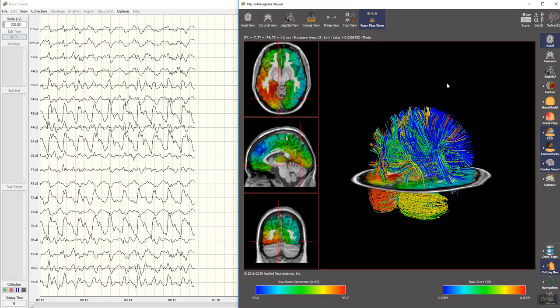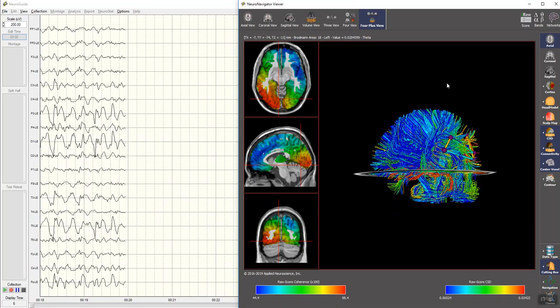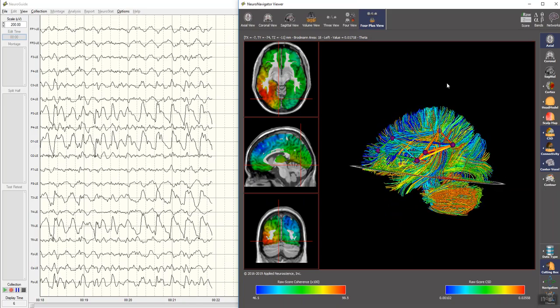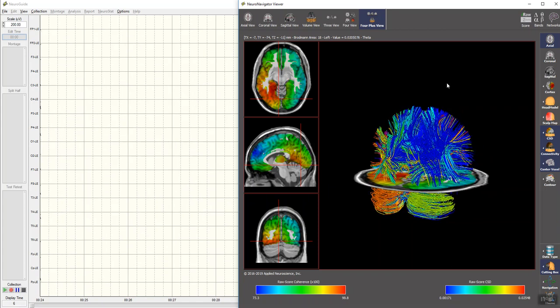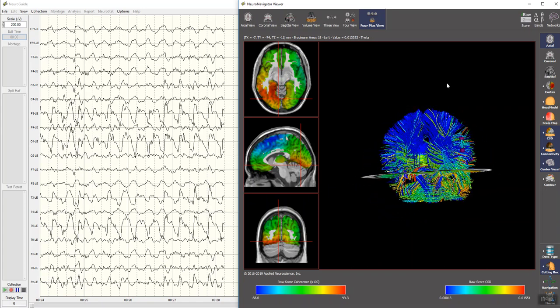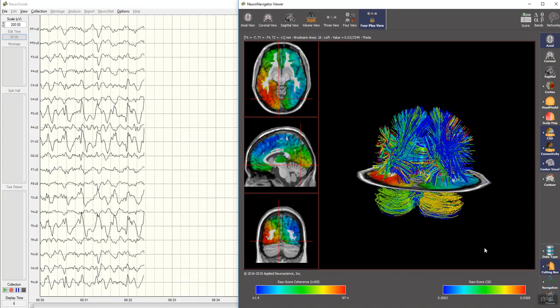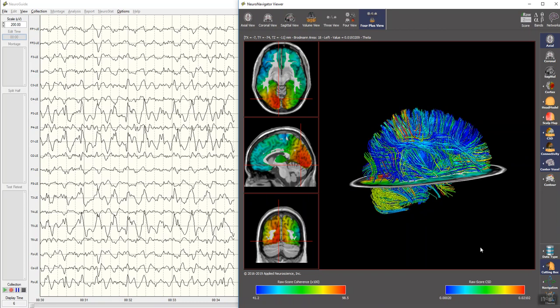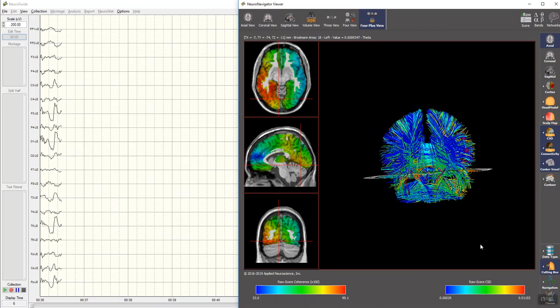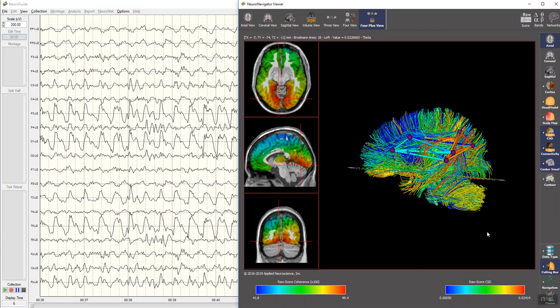It's using 12,270 voxels for the cortex. With the cerebellum, there's more voxels. And it uses boundary element method to localize sources and does not use a spherical head model, so it has high accuracy and can be saved as an image file, or it can be saved as a digital file for statistical analyses if one wants.